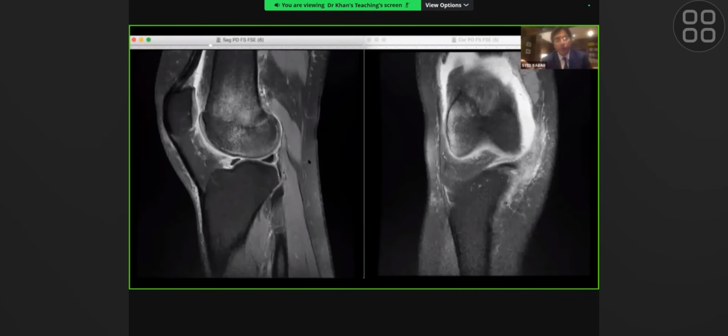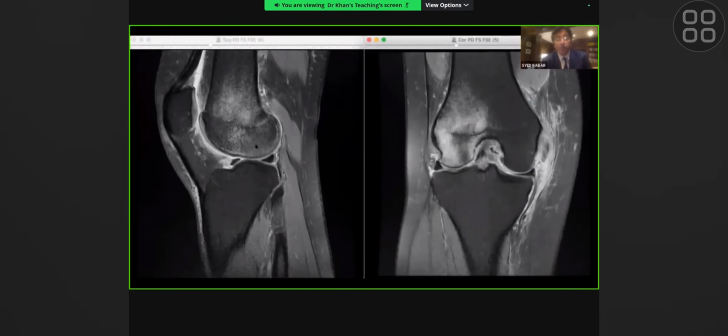So the patella is way out of the way, sitting at the top. It's your tibia, which is sitting right at the front, which is going to take the brunt, because that's the bone which hits the dashboard. So if somebody gets a dashboard injury, this is where the bone contusion and bone marrow edema is going to be. Not at the patella, definitely not at the lateral femoral condyle, which is what you have, because that's the first thing which strikes me.